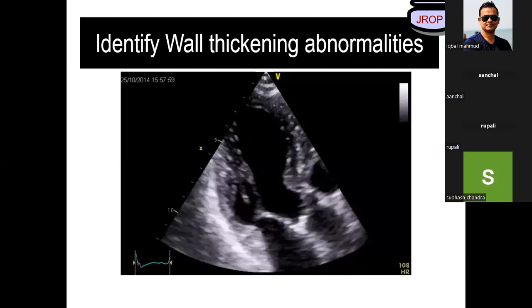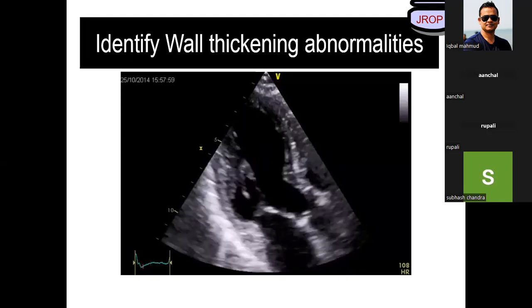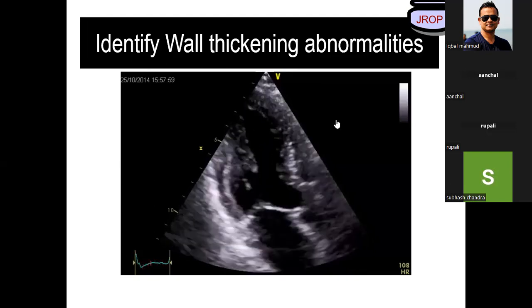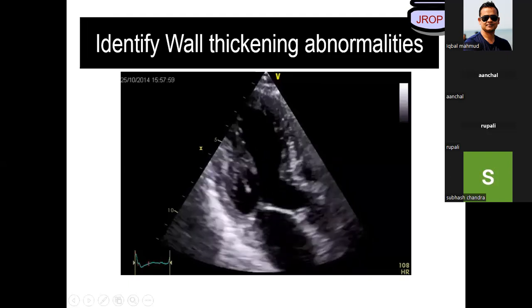There's no SAM. There's no tachycardia. Heart rate is 108. Tachycardia is there, but there's no atrial fibrillation. Anchal, you want to say something? VPC. So tachycardia with VPC.